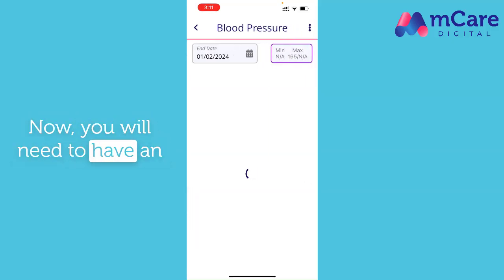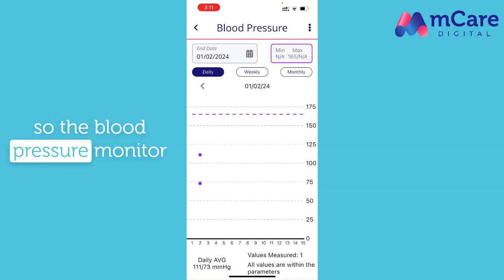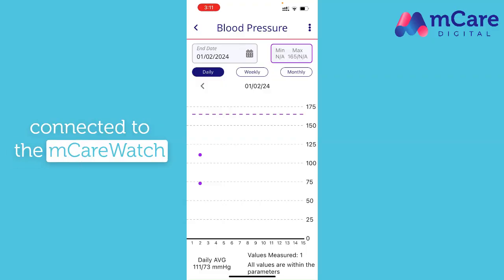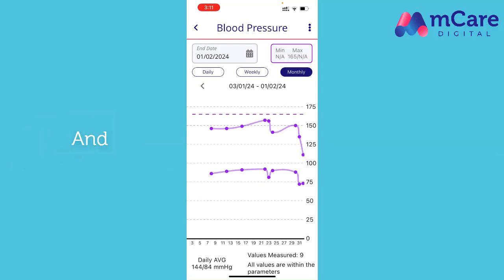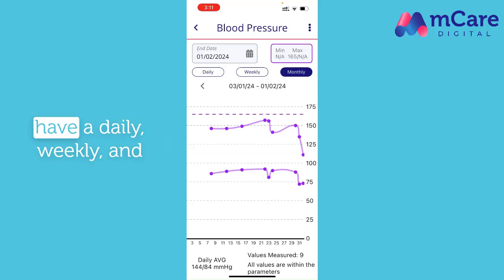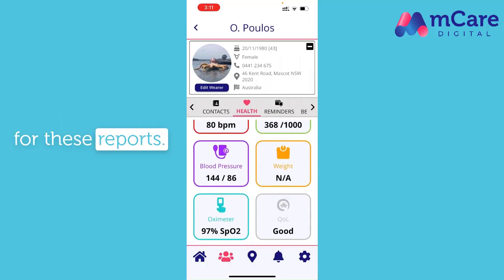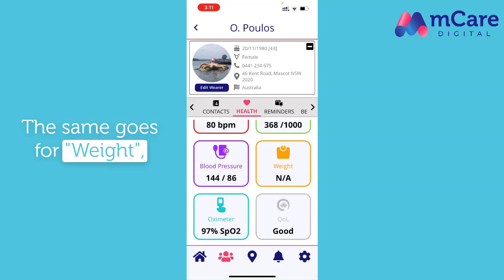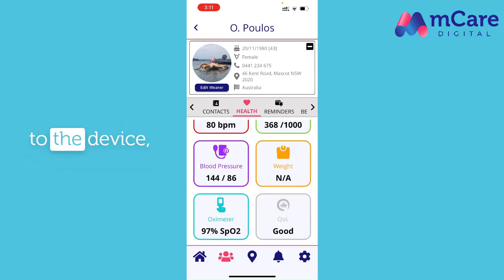You will need to have an additional device connected, so the blood pressure monitor connected to the mCare watch in order to have a reading for these. And you can again have a daily, weekly, and a monthly snapshot for these reports. The same goes for weight, oximeter. These need to be connected to the device.